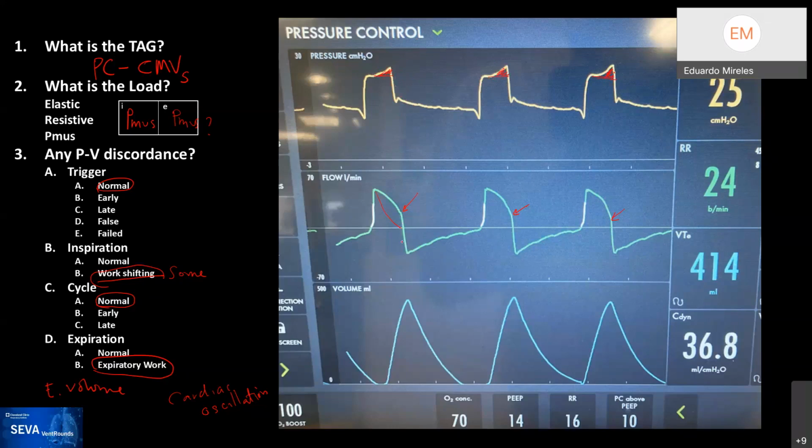And if you see the flow cross without any stop, so instead of if you would have amplified, if you don't see a step up or a step between the inspiration and expiration, then this is unlikely to be a late cycle. I mean, sometimes it could be a matter of gain, but here I don't see any of that. So this is probably just the muscles relaxing rapidly, and that's why you get the increasing pressure because the machine is trying to compensate. Rob, so I would call it normal, just as you did.